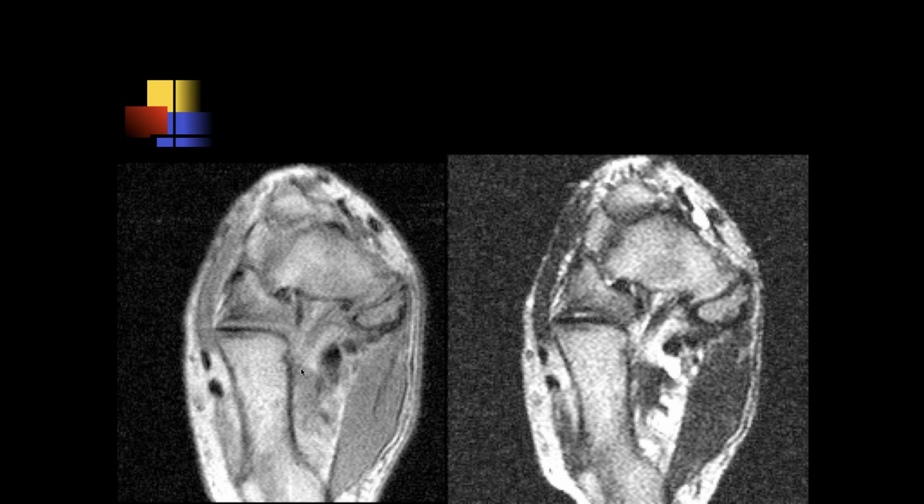Michael, what do you think of this case? Okay. So it looks like there's a kind of abnormal configuration of how the calcaneus is aligned with the navicular.